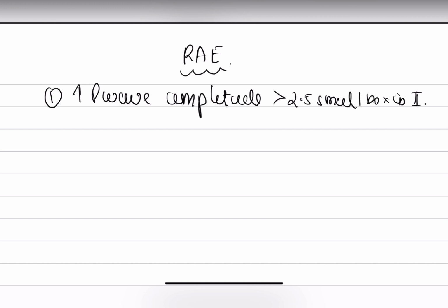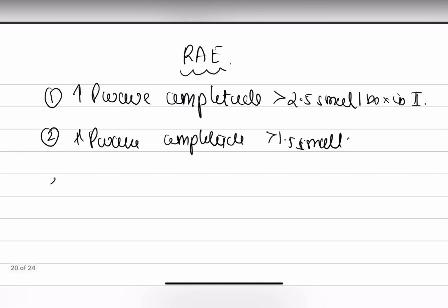If you consider V1, there is an increase in P wave amplitude of more than 1.5 small boxes. The third one is right axis deviation of the P wave axis, more than 75 degrees. These 3 findings give evidence of right atrial enlargement.